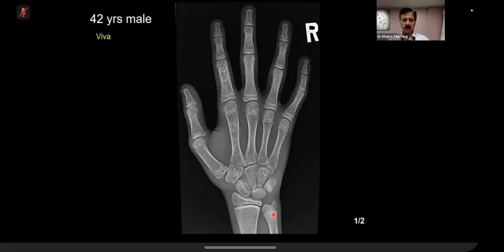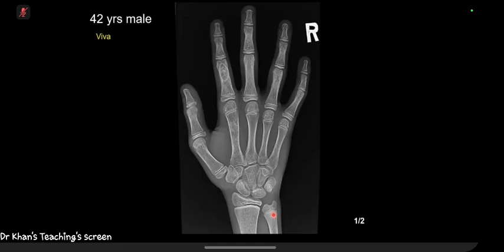Yeah, I think so. There is an abnormality of the right index finger proximal phalanx, which contains within the distal aspect of the diaphysis a well-defined lucent lesion with a thin sclerotic edge that contains some internal matrix with calcification. There's no soft tissue component, no cortical destruction, no significant deformity.